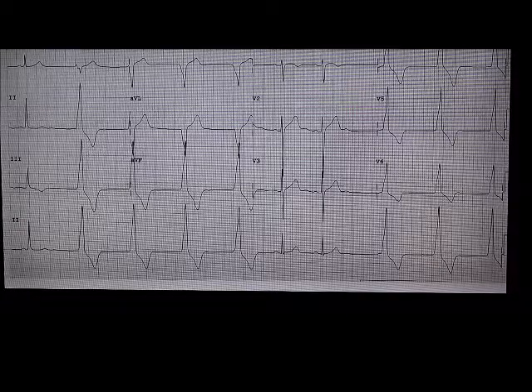Okay, so PVCs by definition are premature ventricular contractions. Premature means it comes early. These do not come early. They're just regular slow wide complexes, with a rate similar to the rate of the sinus rhythm. Okay? So we call it accelerated idioventricular rhythm. When you find the rate within 20% of the sinus rate, this is accelerated ventricular rhythm. And this is benign, yeah, usually. Not all the time, but usually.